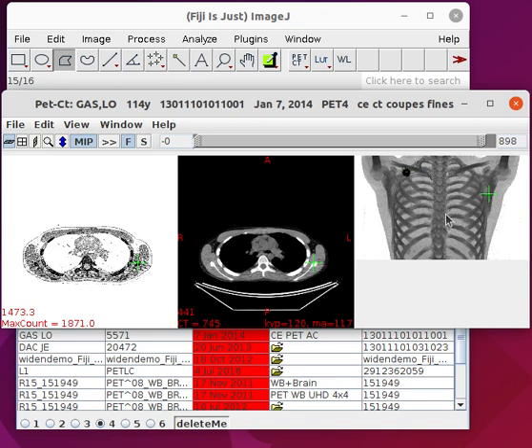And this is the bed which I've cut out, that used to be here. And with that bed, you'd have all sorts of noise of the bed itself. So with the PET, obviously, the bed doesn't absorb any tracer, so you don't see it. But with the CT, you do see it.